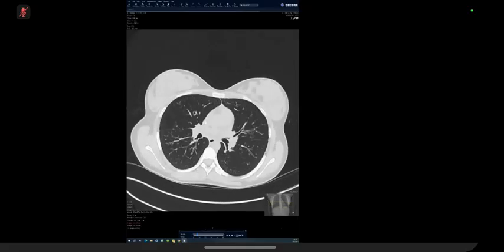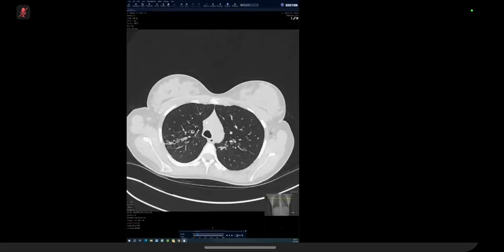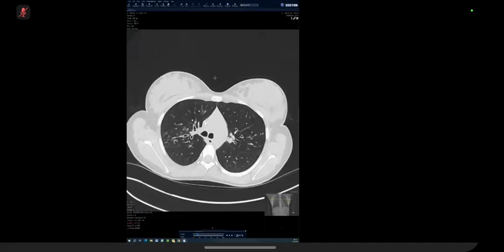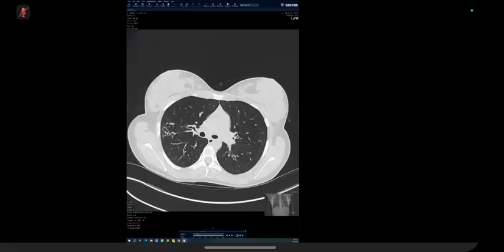Axial plain CT scan of the chest: bilateral traction bronchiectasis with cystic bronchiectasis, most pronounced in the right mid-zone, where there is also associated patchy opacities that have the appearance of tree-in-bud nodularity. And in one of the cystic bronchiectasis, actually both bilaterally, there's endobronchial thickening and further thickening around the cystic bronchiectasis, atypical infections in these patients.